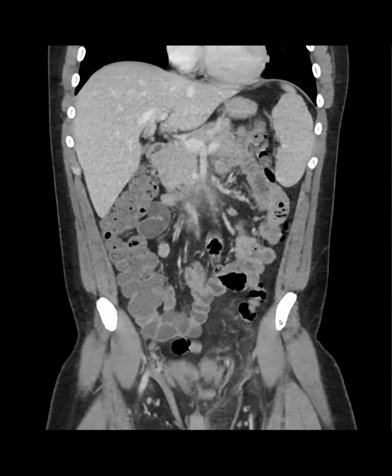Yes. Okay. So this was an elderly female patient who came in for pancreatic mass evaluation. CA19-9 was in the 300s. Not hard to see the findings: a big uncinate mass, a lot of MPD ductal dilatation, almost a centimeter. She did have a history of chronic pancreatitis.